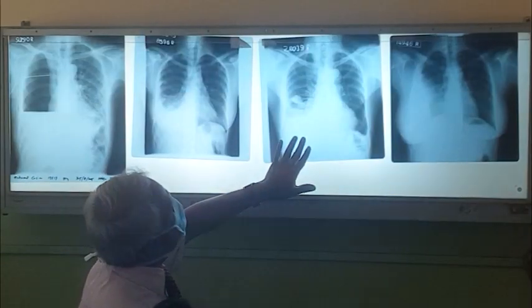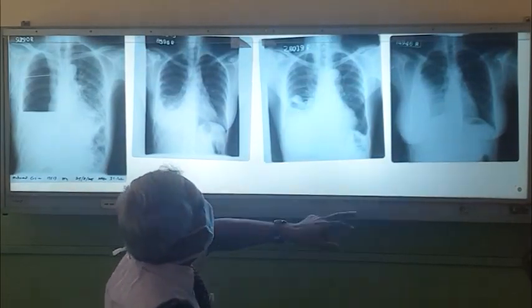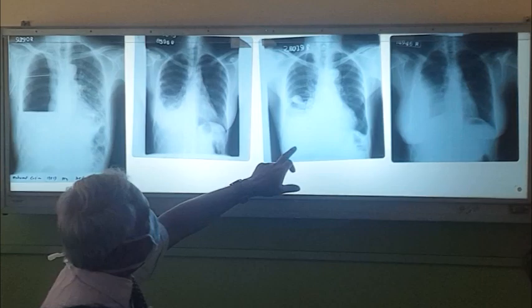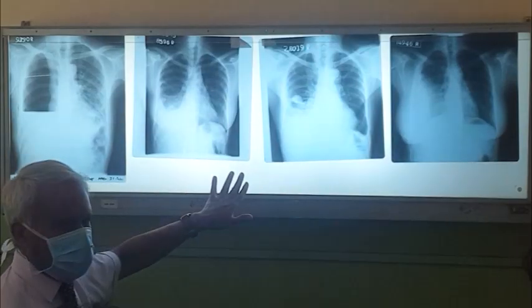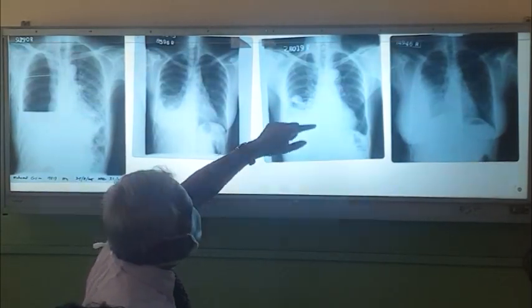Now in this X-ray, fairly well centered, a little bit rotated, you can't see the intervertebral disc there. So this is an underexposed film, and the right hemidiaphragm you can't see. Again there is a concavity like this here. So there is a right-sided pleural effusion. In addition to that, you can see fluid lying there, and there is a rounded opacity, right?